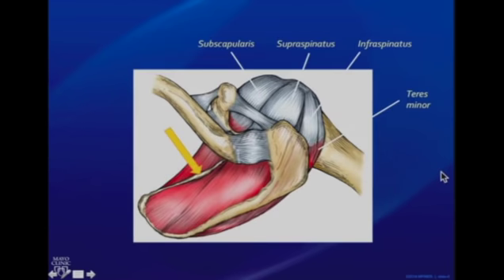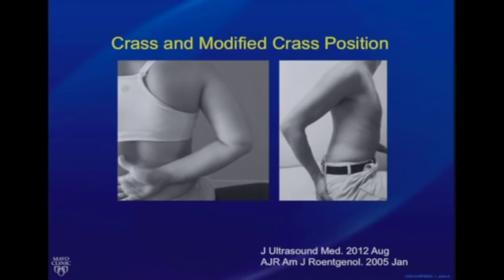Now this is what I call the bird's eye view. This is if you are standing behind the patient and looking down, and this is an important view to understand. We'll talk a little bit more about that view once we are looking at patient scanning.